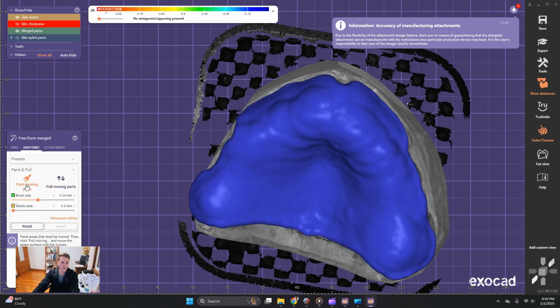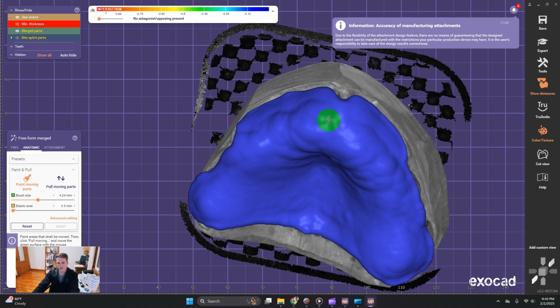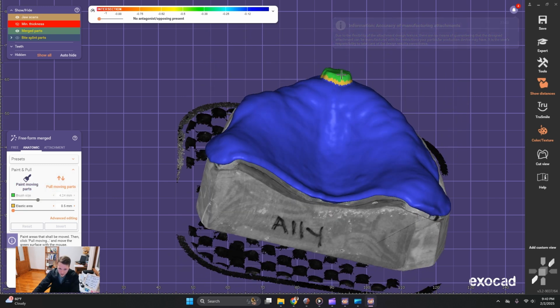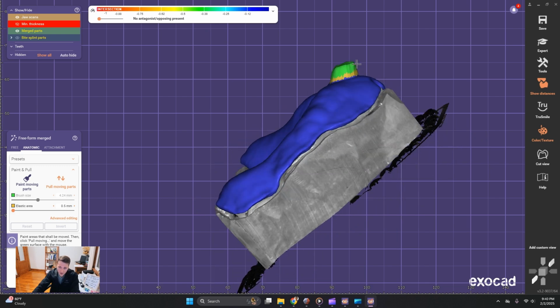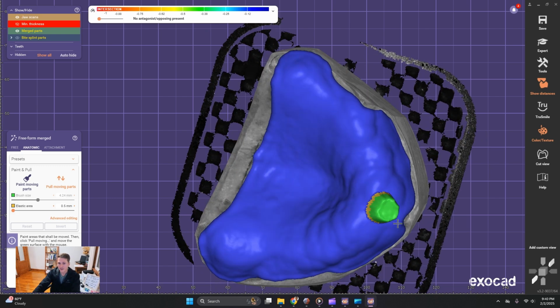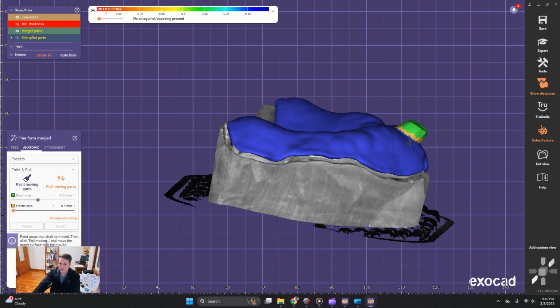So you're gonna hit paint moving parts. He just likes it right here, so that way you can still wrap your lips around the front of the tray, and you still can get a holding point. You just need 3 points of pressure. That's what he likes. So, if you design this for maybe his case, you'll put that little nub on there.